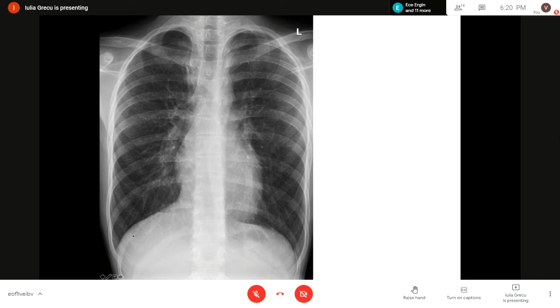They are quite symmetrical. There is another thing. It is a very subtle thing and quite serious. Look towards the apexes of the lungs. Do you find something, are they symmetrical, or is there something wrong on one of the sides?